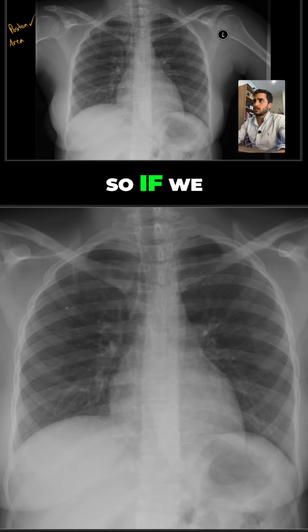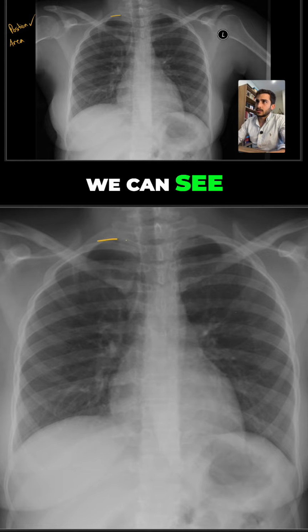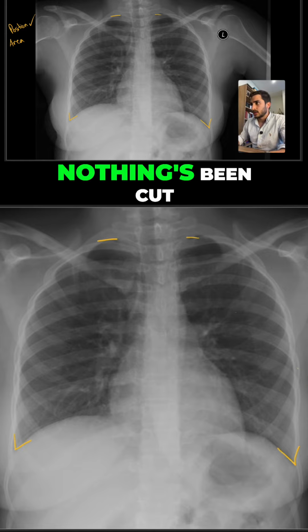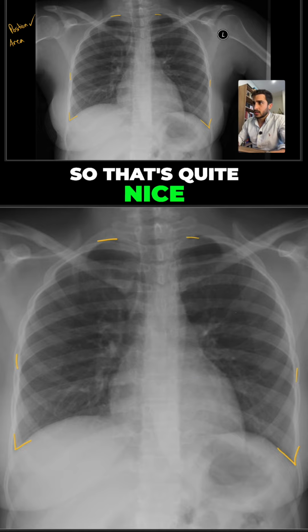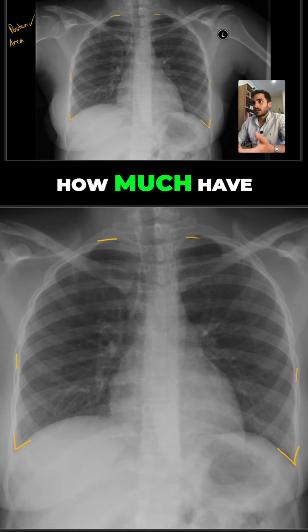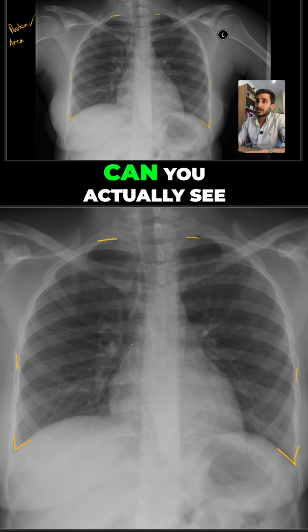So if we look at the lungs, we can see the top of the lungs very well. We can see the costophrenic angles on the bottom. Nothing's been cut off from the side, so that's quite nice. All of the lung is essentially visible. Now the question is, how much have they breathed in? So how much of the lung can you actually see?